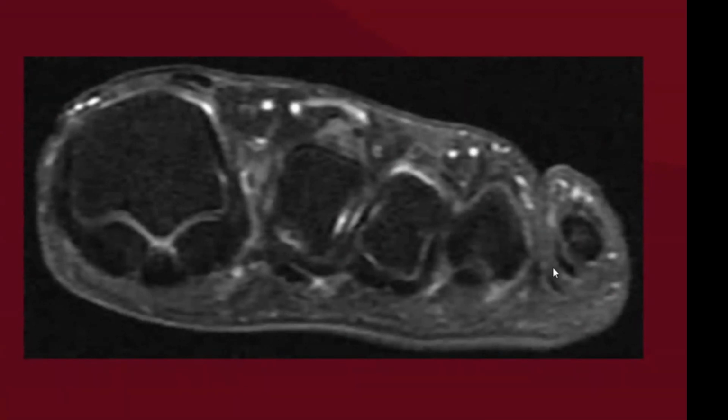Looking at the transaxial image, what we're looking for is a U-shaped structure as we described in our illustrations, looking from the region of the flexor tendon to the level of the plantar plate, of course, in the region of the accessory and proper collateral ligament, which we really can't dissect off of one another in the normal situation. So this is at the level of the typical rectangular shaped metatarsal head that is taller rather than wider.